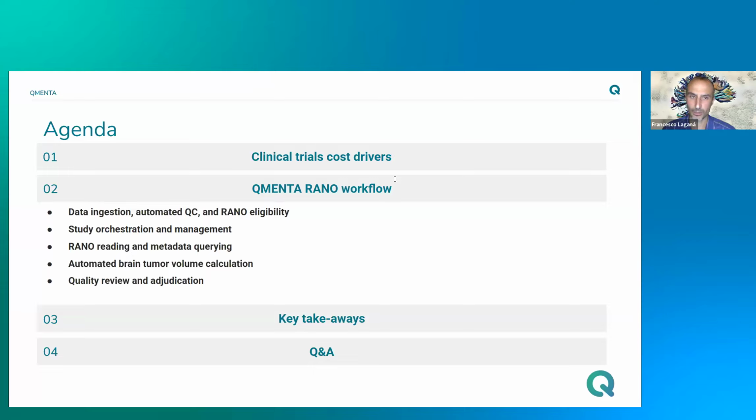I am delighted to be joined by a brilliant colleague, Evie, our neuro-imaging product manager. Throughout the demo, you will see the two of us switching hats to replicate a real-life clinical study setup. We'll be stepping into the roles of the data manager, study manager, and expert reader to show the entire workflow end-to-end. This way, you can see how QMENTA supports every critical user in your clinical trial team.